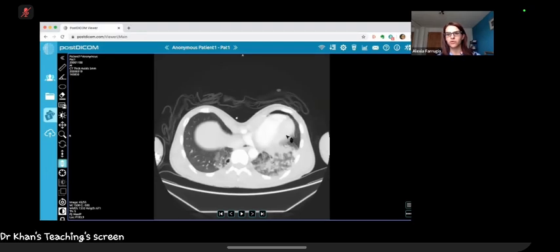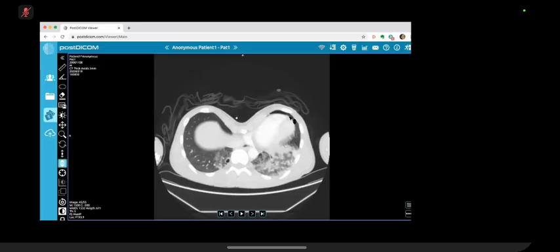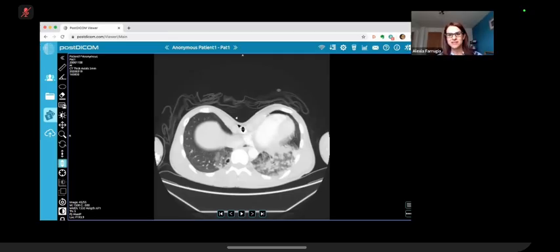And there was a small left pneumothorax in the apex. So well done. You just need to keep looking for more with these trauma scans. And this is pectus excavatum, right? And yes, well done. Significant pectus excavatum. Great.